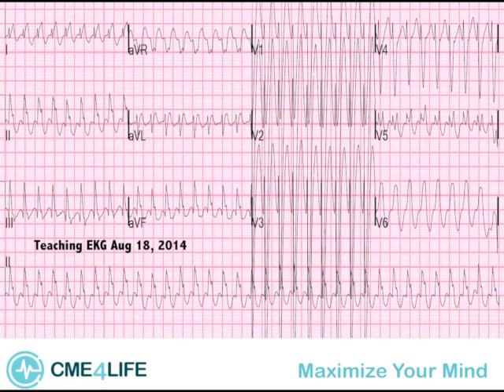Our whole goal is to help you maximize your mind, to really teach you CME, continuing medical education, that you remember for life. This is the last EKG of our series. We will start a new series on Monday. Please stay tuned. So, August 18th, rhythm strip and 12-lead EKG interpretation.